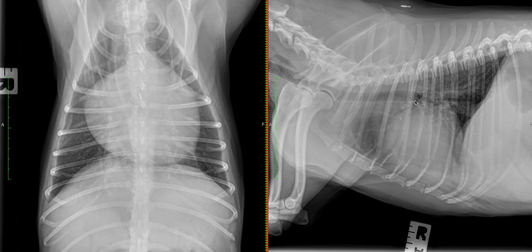And if we draw an imaginary line from the terminal trachea to the region of the cardiac apex, we have a disproportionate volume of soft tissue cranial to that margin, suggesting an increase in the right to left ratio of soft tissue. The pulmonary vessels are relatively normal in size. The remaining findings will be discussed in the report. Our principal conclusion for this patient is generalized cardiomegaly with primary roundness of the shape and equivocal right-sided enlargement.